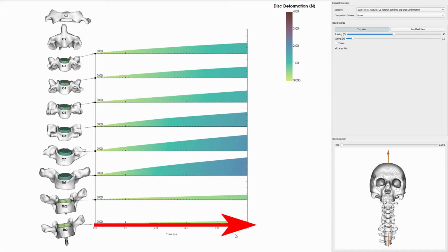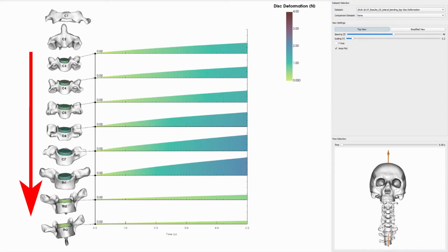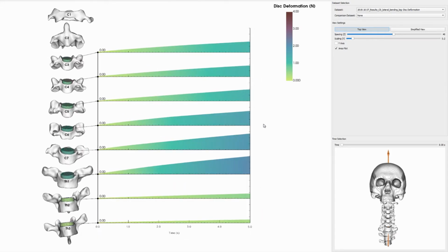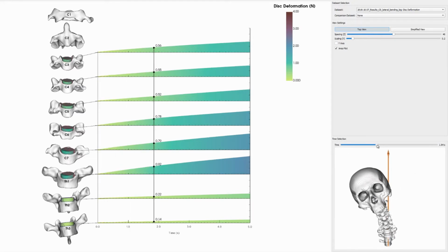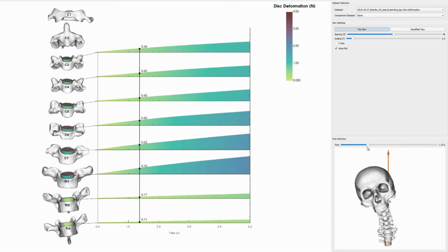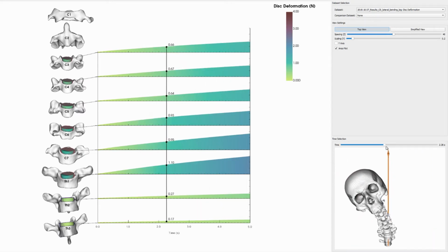We keep their anatomical correspondences as correct as possible, so the expert can, for example, evaluate a force distribution from the spine's top to its bottom. We connect the displayed values with a performed motion. This gets visible when the time slider is used. We show an animation in this smaller window. For example, here we have a slight rightwards head tilt.